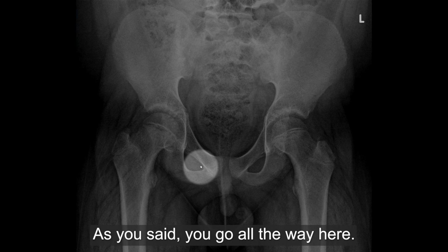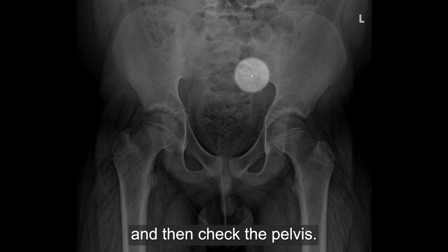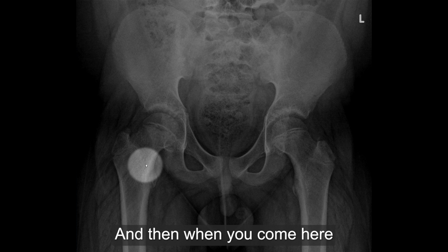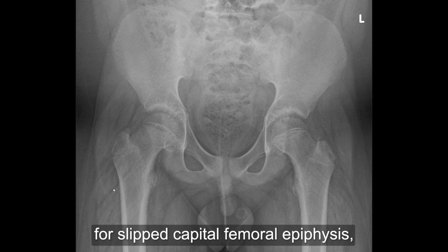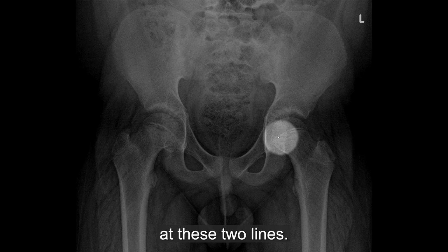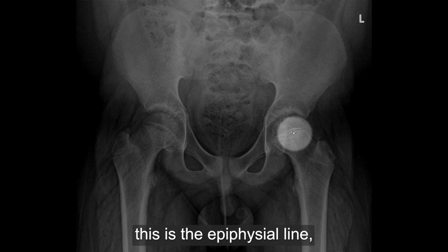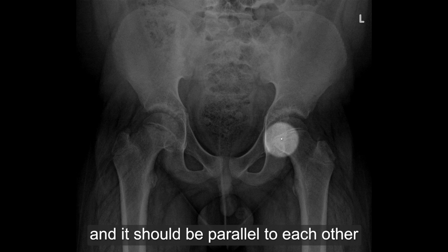We go all the way along, check the pelvis, it looks fine, the arcs look okay, everything looks fine. And then when we come here, again, there's nothing major if we are just skimming and following. But because we're looking for slipped capital femoral epiphysis, we have to look carefully at these two lines. This is the epiphysis, and this is the epiphyseal line. It should be uniform and parallel.